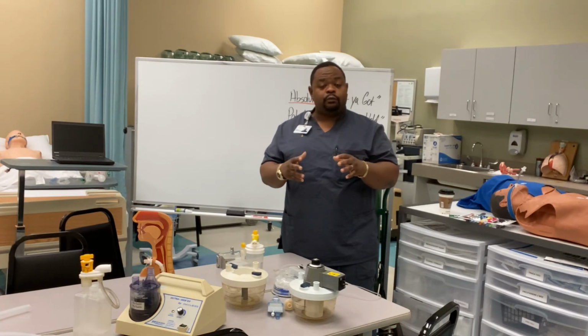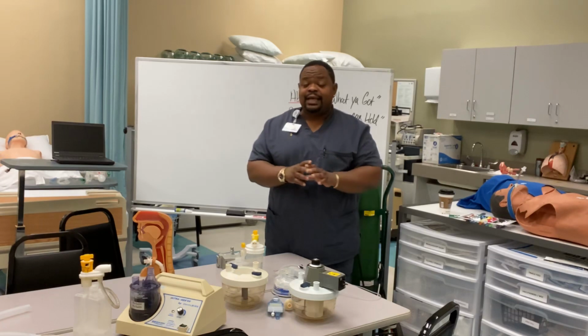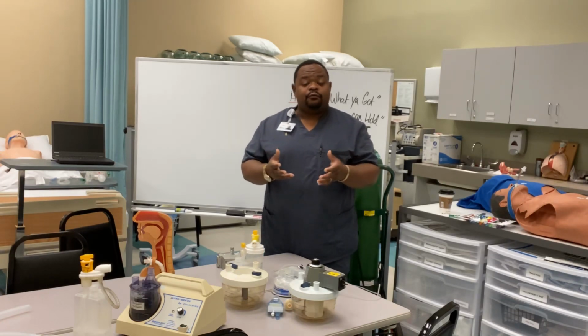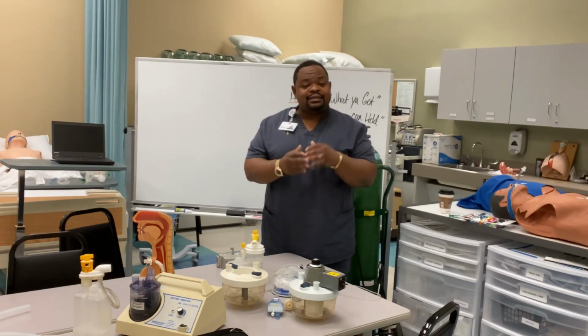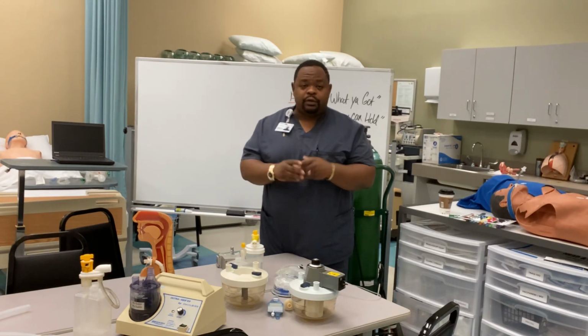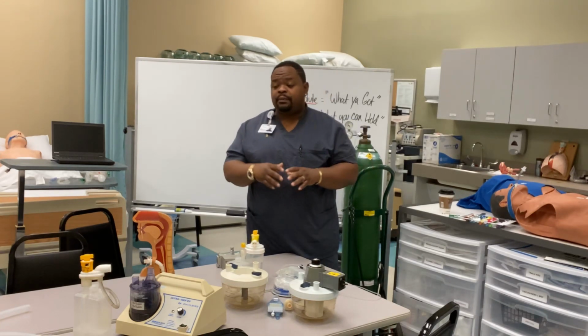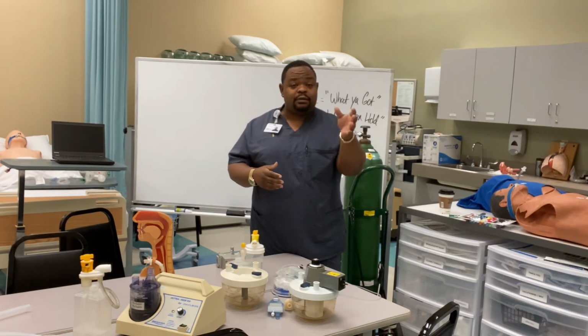It's very important. We know what the dangers of not having humidification are, and if we overlook that, it could be detrimental to your patient from sheer laziness, right? Don't let the small things cause big problems. You worry, and I understand a lot of stuff is going on. People are having CPR coding, ventilators are going off, and you worry about a little water bottle.